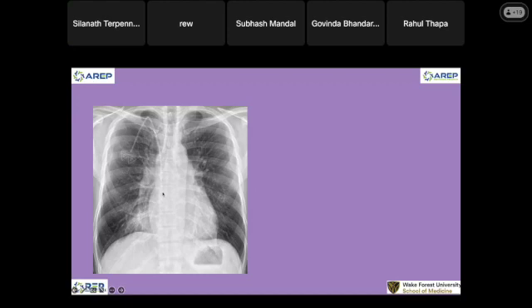If I can tell, this person is here for an annual checkup, which means either the patient does not have symptoms, or has something chronic that needs long-term antibiotics or long-term chemotherapy. That's why he has this port. The port is better than an IV because it lasts longer, sometimes 6 months or even a year, if you take care of it very well and it's not infected.